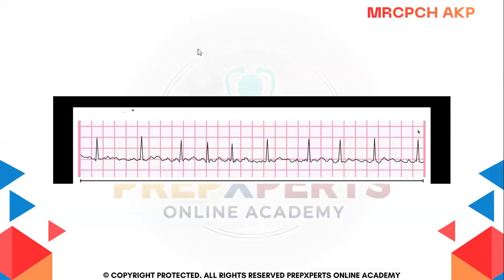Dr. Shanze, 170 beats per minute. Okay. It's an irregular. Very nice, Dr. Javeria, Dr. Hafiza Javeria. That's a very good answer. It's an irregular rhythm. Very good. And what is the heart rate? How do you calculate the heart rate? I'm telling you that it's a 6-second strip, okay? And you can count the large boxes. There must be 30 here.